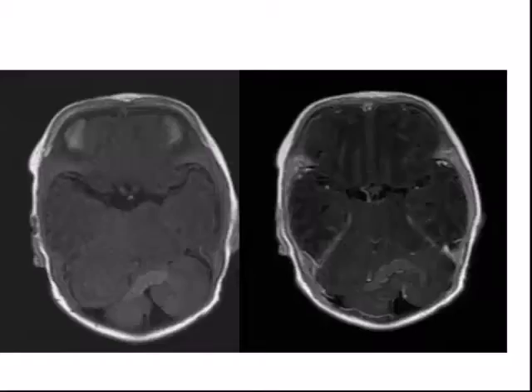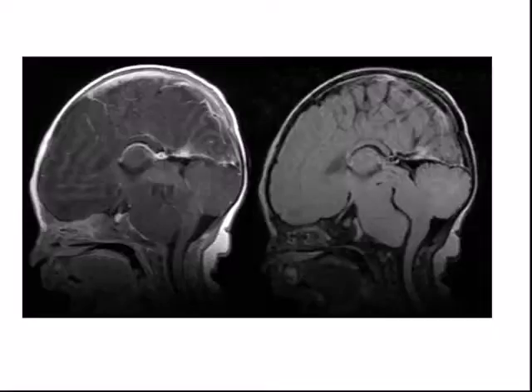And of course, none of the senior people are around, so you're trying to figure this out. I did give gadolinium. It did enhance. But I also wasn't sure where it was coming from. And that's really important. You have to know where the tumor is coming from before you really figure out the differential. So I don't ever do a sagittal flare in a baby. I did in this case because I was worried that it was coming from the suprasellar area.